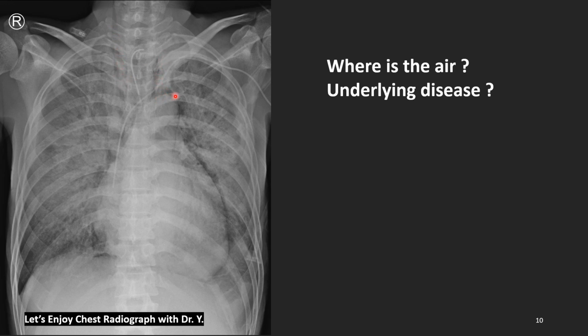We see the aorta outside, we see the outside of the heart, ventricle, and the inferior portion also shows the black contrast, the right atrial border, and the right side mediastinal border all show a black line. And we also see the outer wall of the left main bronchus, meaning air contrast at the outside. This is pneumomediastinum, extensive pneumomediastinum in an ARDS patient.